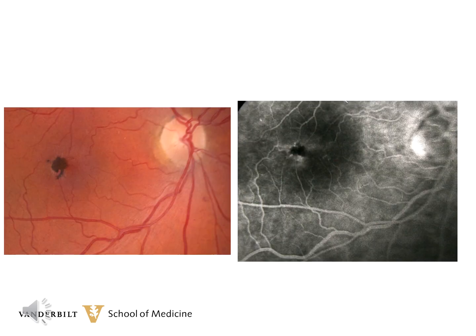The final example of pigment migration in the retina is presented here, and is quite dramatic. This patient has macular telangiectasia. Pigment migration to the superficial retina, especially temporal to the fovea, is one of the classic signs of this disease, and it is most often bilateral.